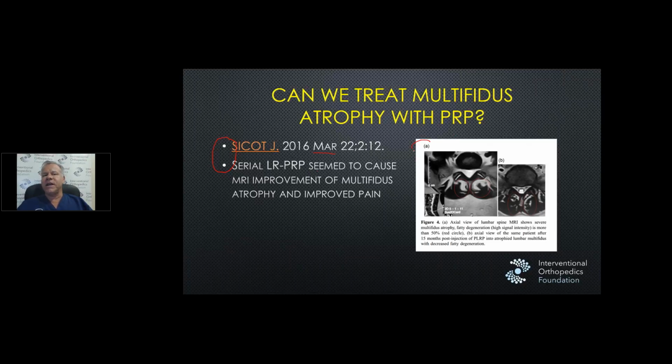One of the things I've seen talked about on the Biological Orthopedic Society and LinkedIn is that the MRIs they put in their paper look like they're a little bit off on the comparison. So it looks like this one's at a slightly different level than that one. So something to consider, and it's one of the reasons why we're going to redo this study.